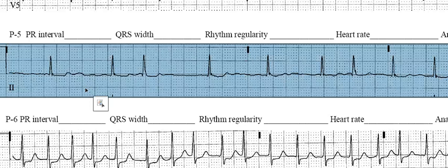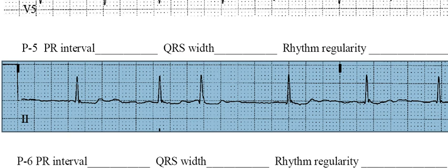Okay, we're on strip number 6 of the in-class practice sinus rhythm strips. We're looking, well, I'm looking, and I am seeing a lot of irregularity. I'm seeing some bumps, and so let's take a look at this. Let's blow it up a little bit.